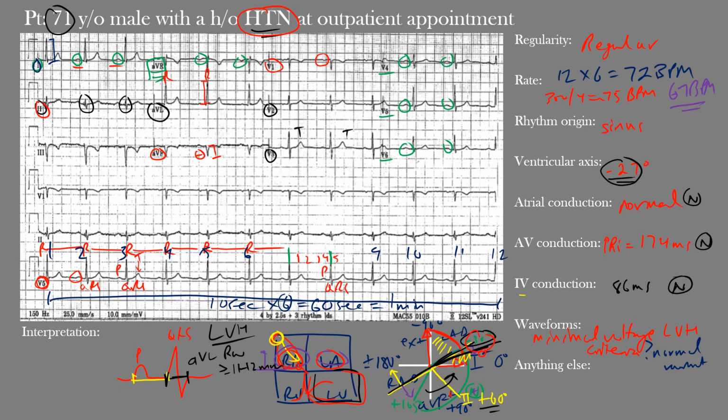The R wave progression in the precordial leads appears generally normal here. There does appear to be something going on in leads V3 and V4, but it may simply be due to misplaced leads, as the R wave in V5 regains its dominance.